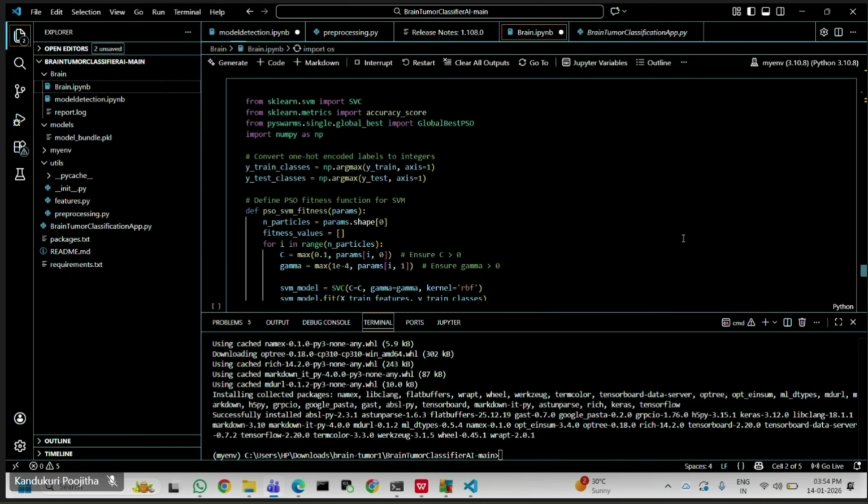Coming to how we used GLCM in our project, we have a set of input images which we need to convert into grayscale. For each image, a GLCM matrix was computed using specific directions and distances. From the GLCM, we extracted features such as contrast, energy, homogeneity, and correlation.